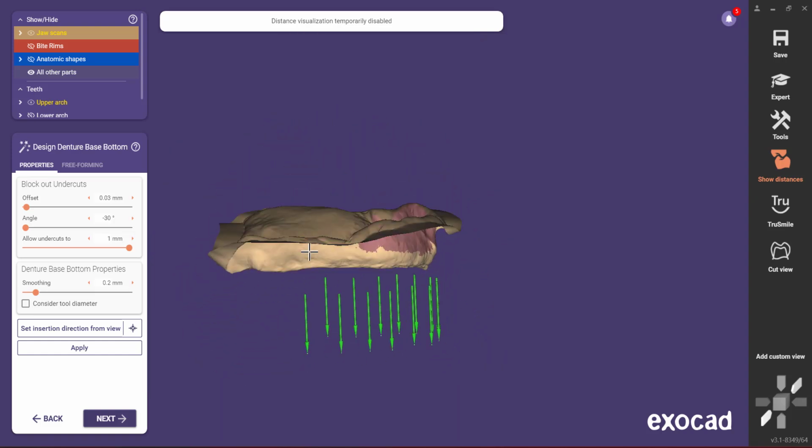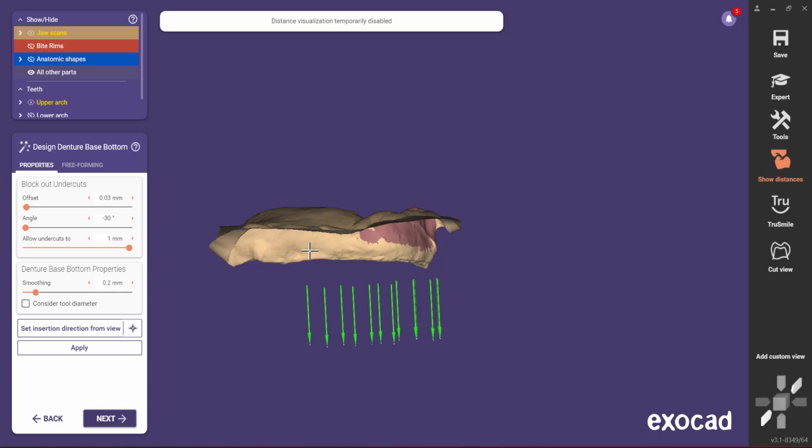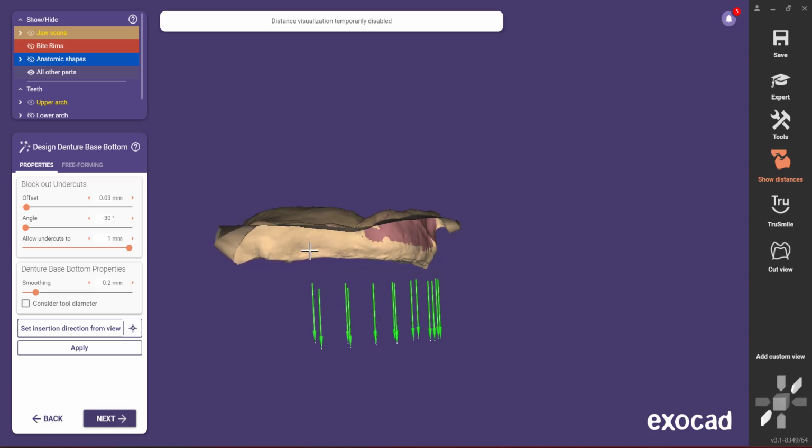All right, so this is something you're going to lose if you do this in the conventional crown and bridge module, which is that when you generate this big chain of teeth, that's going to get printed in white, your base is going to get printed in pink, and you've got to fit those two together. So they've all got to have a common path of draw. So there's a little cheat step that I do to overcome that, but it adds a step.